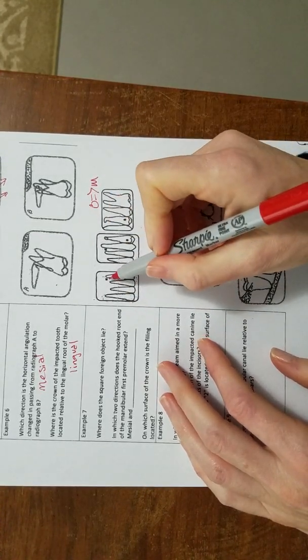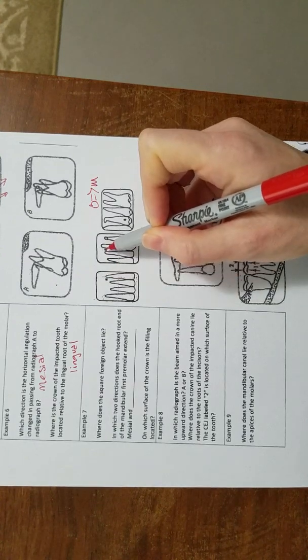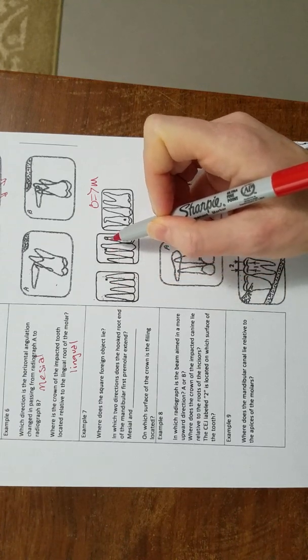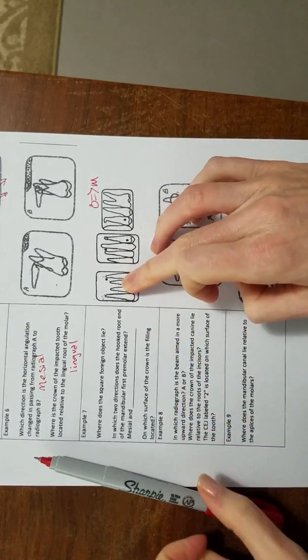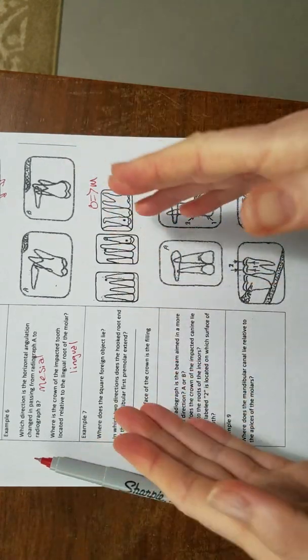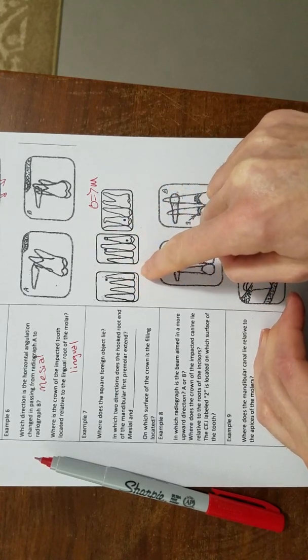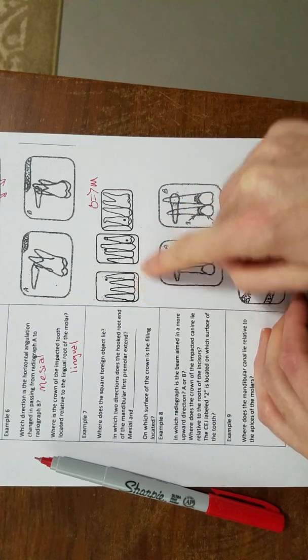So then you look and see how the objects moved for each one of these. So this seems to go a slightly more distal direction, or if you think about the angulation of the beam in a vertical angulation, the roots all got a little bit longer here. Like here's, I think this is actually a mandibular.